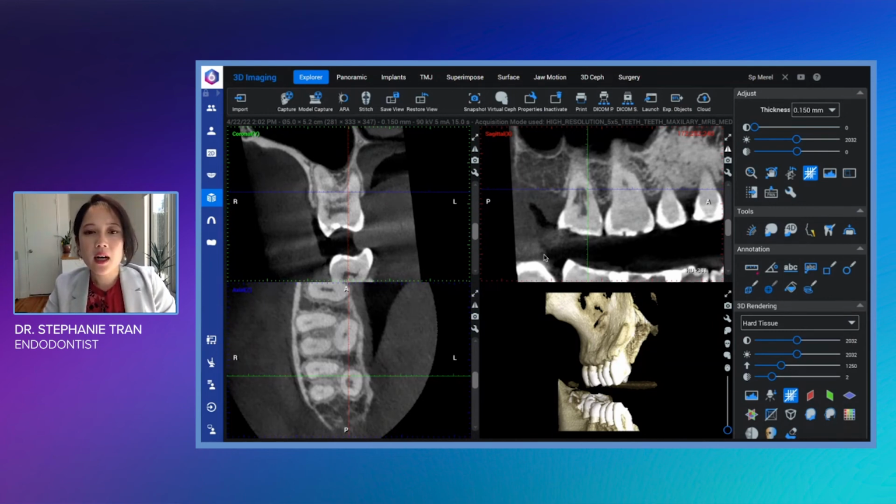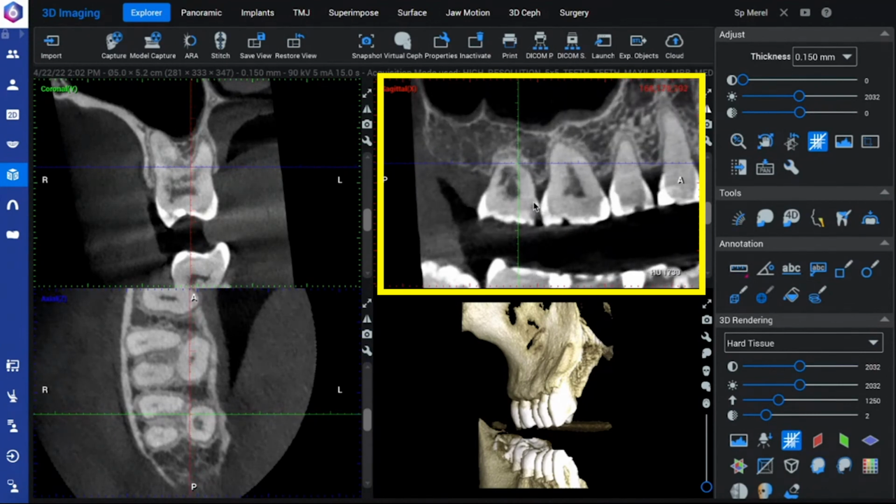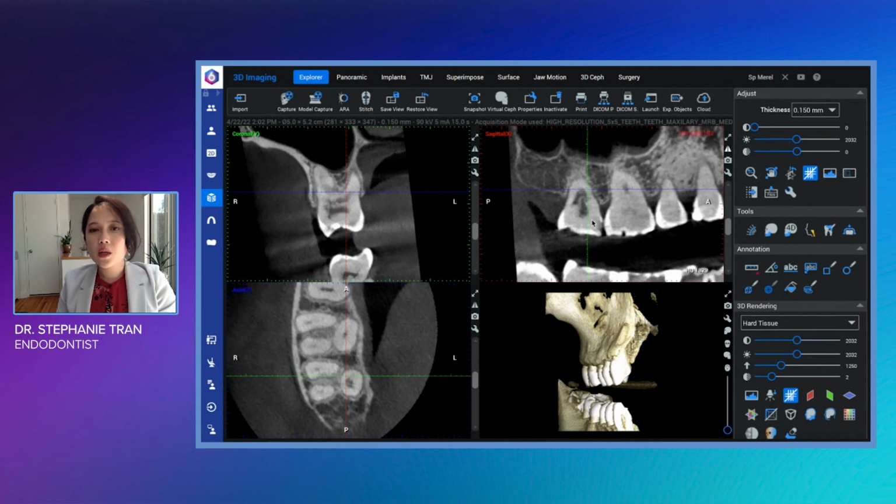Instead, the tooth was recommended either for an extraction if the tooth became severely symptomatic, or unfortunately, this was not a tooth that we could just watch very easily because this patient had that large caries on the mesial. That's another issue in this case. We can see that extensive mesial caries and how it's very close to the pulp horn. In this case, the patient could possibly consider a direct restoration, but the patient understood that there was a very high risk of the pulp developing irreversible pulpitis after attempts at treatment.